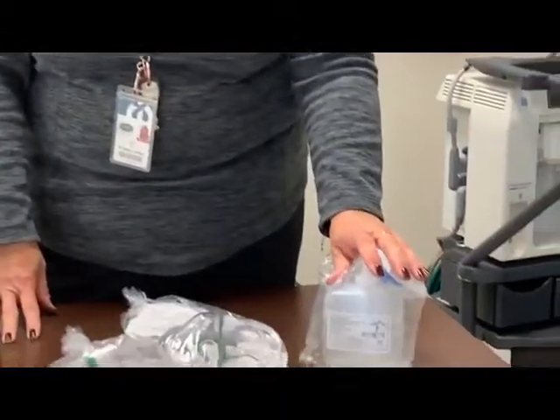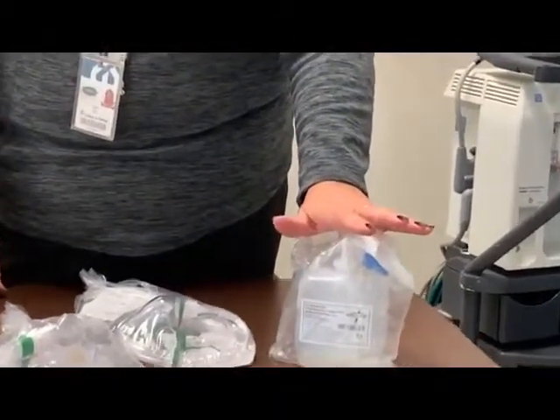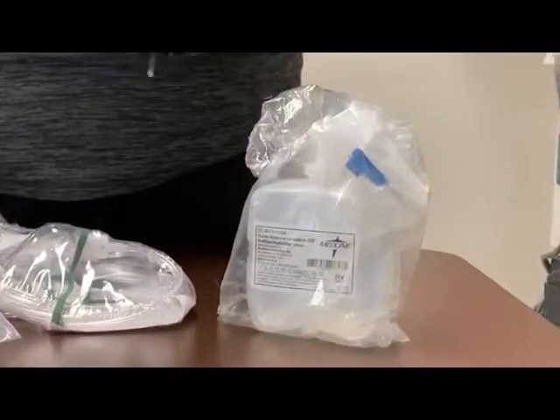So this is a brief video that's going to talk about low flow devices. The devices that we're going to be focusing on are the nasal cannula, the simple mask, and of course the non-rebreather is what we will end up with. The other device that we have here on the table is called a bubbler. That is going to be added to the nasal cannula, which we will demonstrate in a minute.